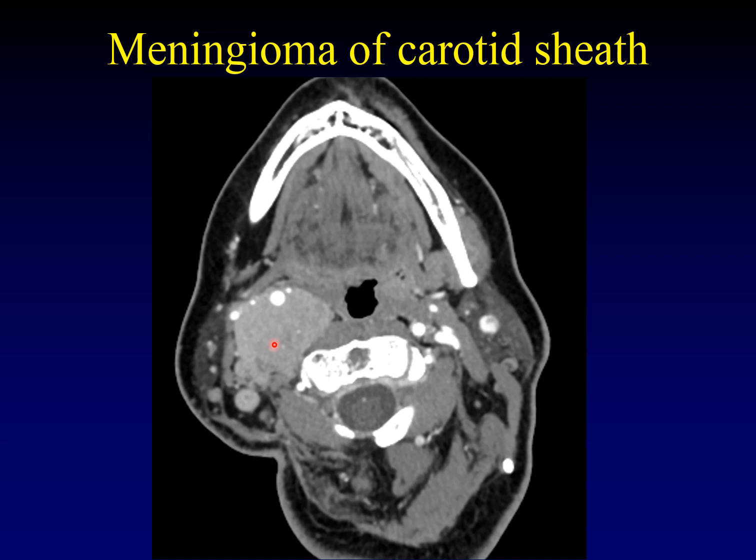Of course, the key to this diagnosis is to identify the spread down from the skull base. Most meningiomas that traverse the skull base will induce hyperostosis, enabling you to make a specific diagnosis at the site of the primary.